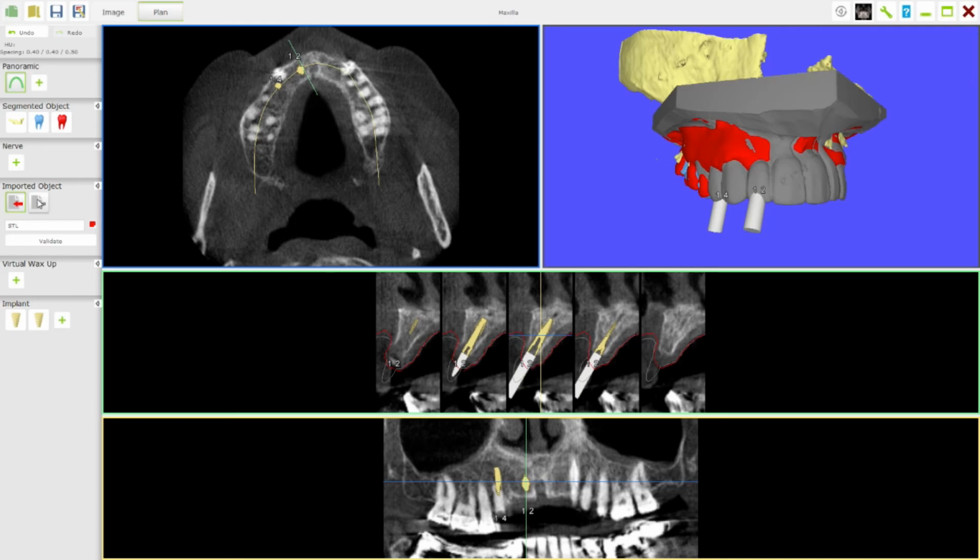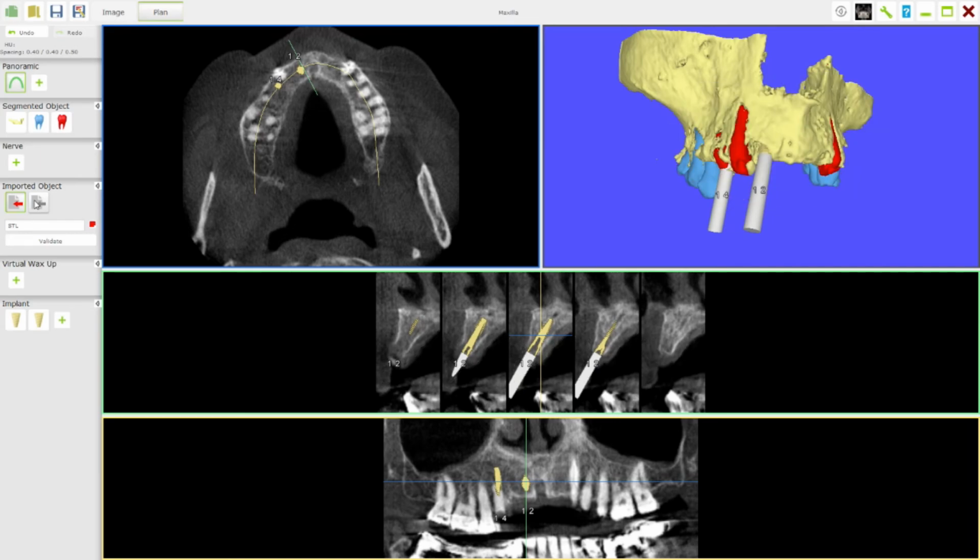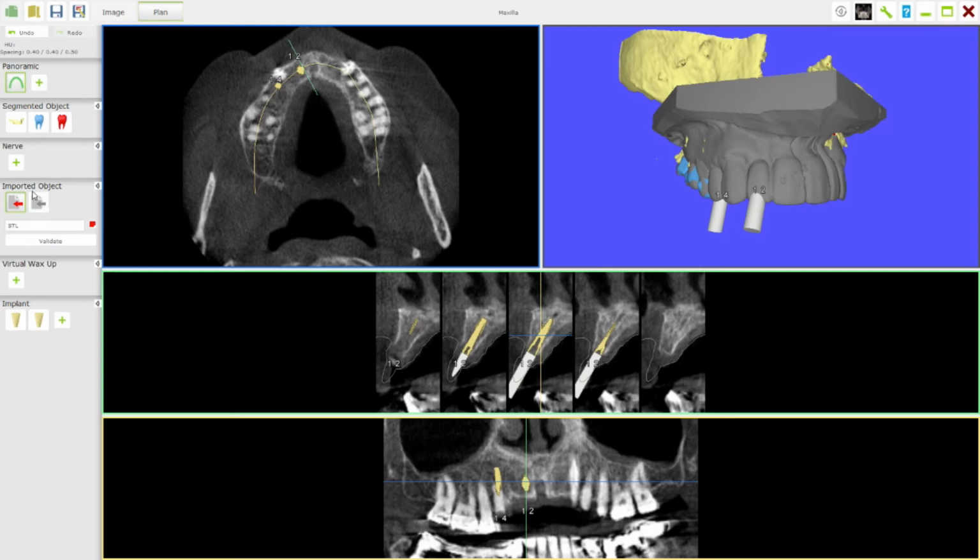Now, to get the teeth out, I would right click again and the teeth would go. If I don't right click out, the teeth remain, and then if I right click on here, obviously the gingiva comes in and out. So we can click in and out as we want. I can keep the gingiva, I can click out the model, so now I just have the 3D image of the bone and the teeth, or I can right click and put the teeth in, I can leave the teeth in, and I can right click and put the gums in, or I can right click over the teeth and take the teeth out. So I have flexibility to be able to switch between the different views.